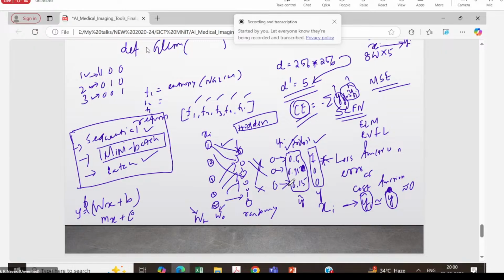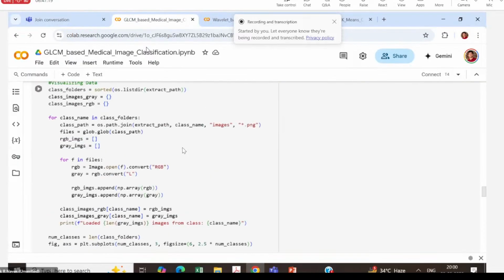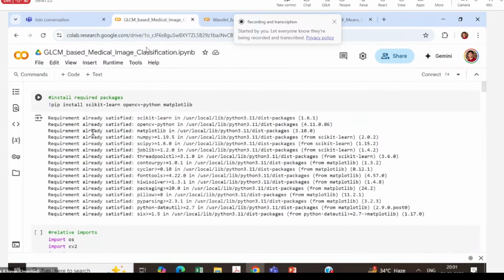There are multiple platforms on which you can write the code. I've chosen the Google Colab platform, which is easy for me. You can also choose Kaggle as a platform. You can install Jupyter or Anaconda, whatever you want, on your system, which is required to load and analyze the images. You can install all those packages locally and run them in any browser, like the very popular Jupyter. But for simplicity, I have chosen Google Colab as my platform, which is online and very easy to install. Only one thing you need to remember.